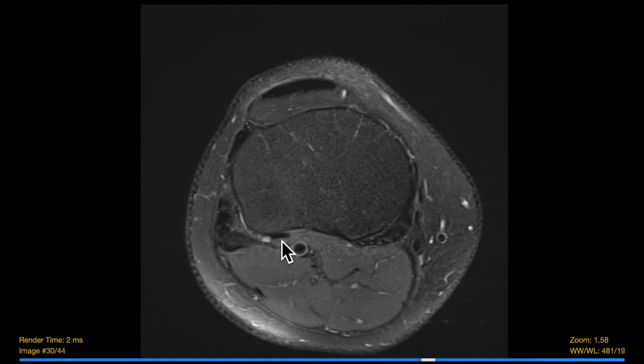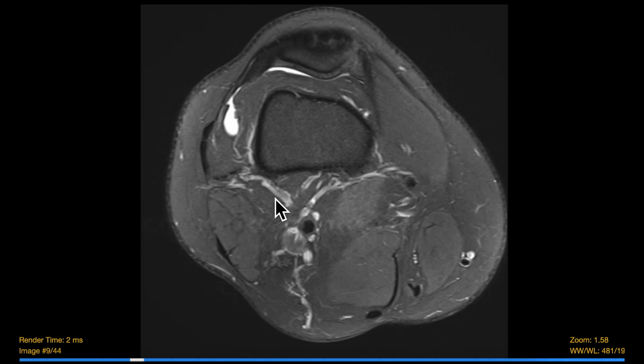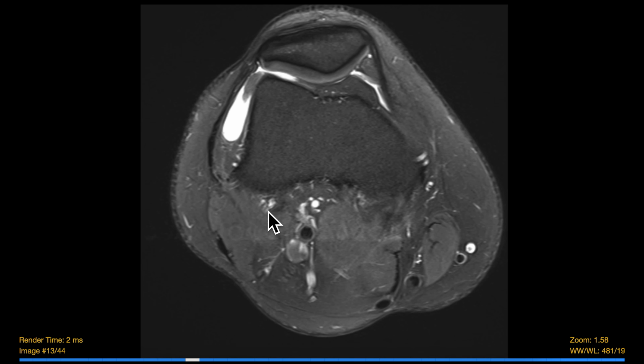But you can have other cysts at the knee. So for example, this is the popliteus tendon here, and you can see that there's a small volume of fluid here. Sometimes this can become more loculated as a proper ganglion cyst in the popliteus hiatus. You can also see smaller cysts at the medial and lateral gastrocnemius attachments. For example, in this case, we see these very commonly and we consider them within the remit of normal unless the patient is specifically tender there.